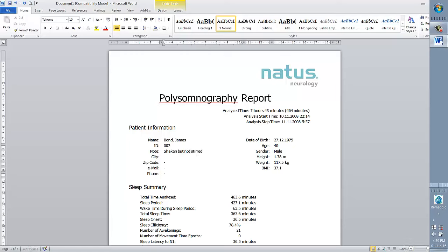So you see here that this will be all the information that has been published over: the total sleep time, the sleep onset, the sleep parameters. You can see all the sleep stages, the AHI for supine, non-supine, and I can choose any of these parameters here. You see it's a long list. For example, I can just choose apnea index. So this will show me all the apnea index in the respective sleep stages. I can even choose, let's say, hypopnea index. You see, it shows you all in the respective stages.